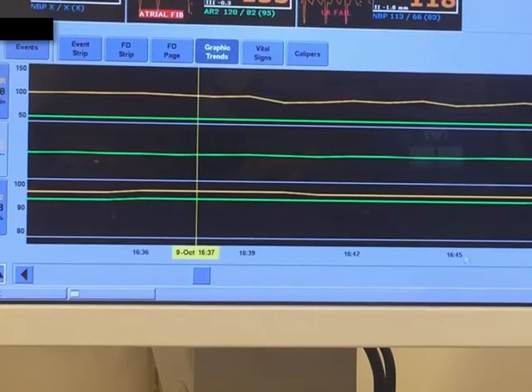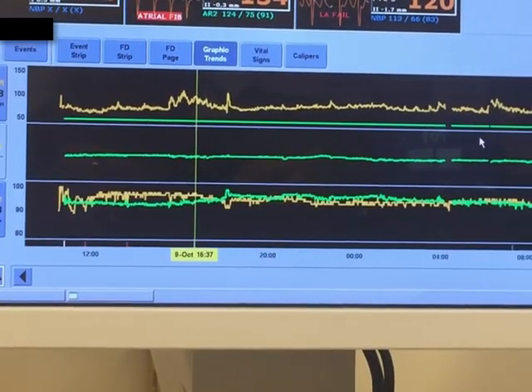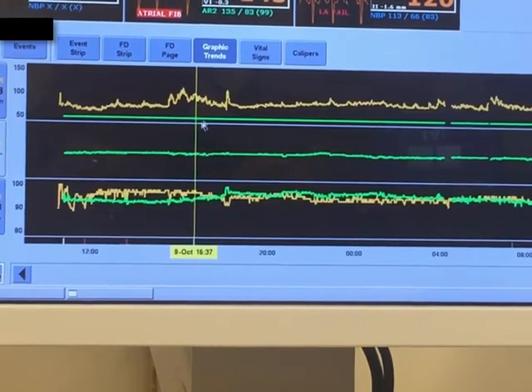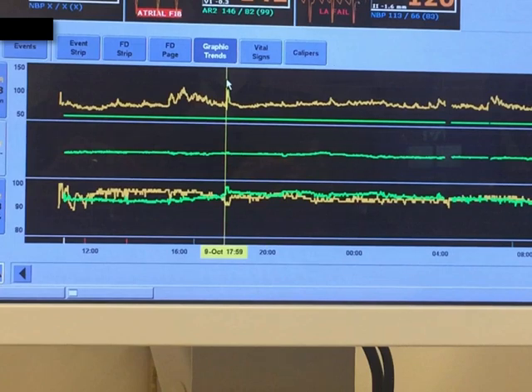It is generally best to start with a 24-hour view of the heart rate to assess the heart rate trends over an entire day. This is particularly important in patients in whom medications that affect the heart rate are being titrated to achieve a desired response. Furthermore, in the 24-hour mode, one can easily see abrupt changes in heart rate that may indicate that an arrhythmia has taken place and should prompt further evaluation.